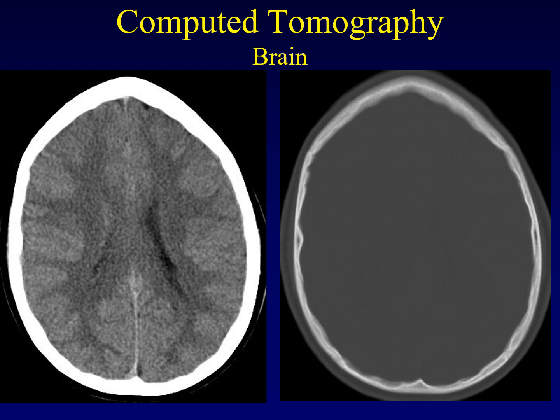Moving on to computed tomography. When you're looking at a tomogram of the brain, it's really important to go back and remember what we talked about previously about window and level on CT. As a review, when we create an image with computed tomography, the possible range of values for each pixel on the CT is something like 4,000 different possible values. There's no way that your eye could distinguish 4,000 different shades of gray.